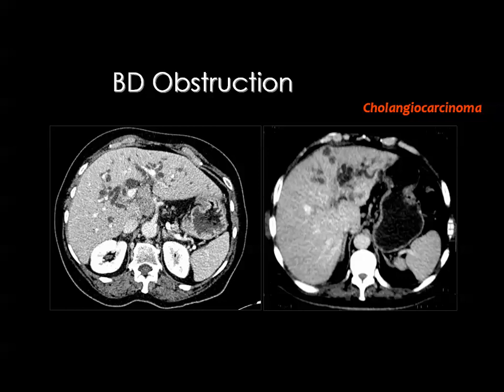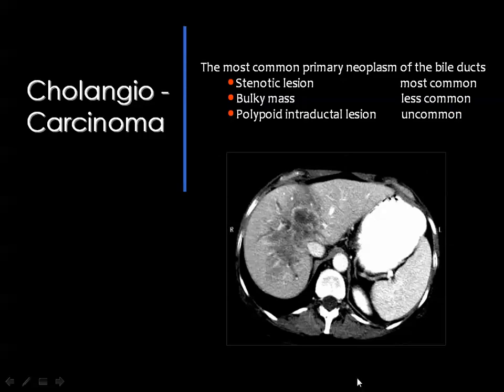And according to the literature, most of the strictures in the biliary system are usually on the malignant side. Then if you see localized dilatation of the bile ducts without a previous history of intervention or infection, then you should assume that there is a stricture obstructing the duct draining these ducts, and the diagnosis at that time will be cholangiocarcinoma.